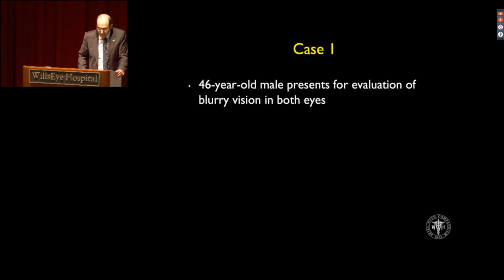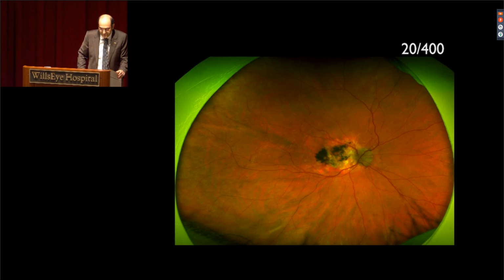Starting with our first case, a 46-year-old male presents for evaluation of blurry vision in both eyes. Dr. Sivalingam, would you please walk us through these images?